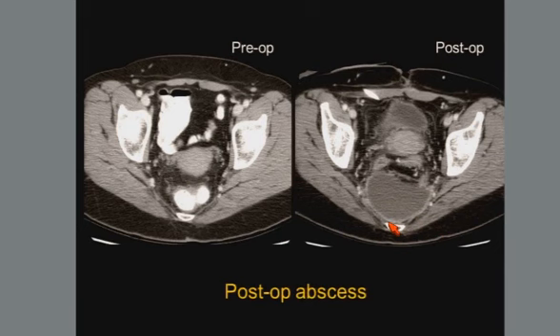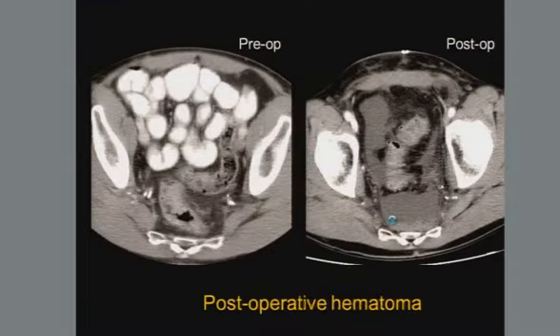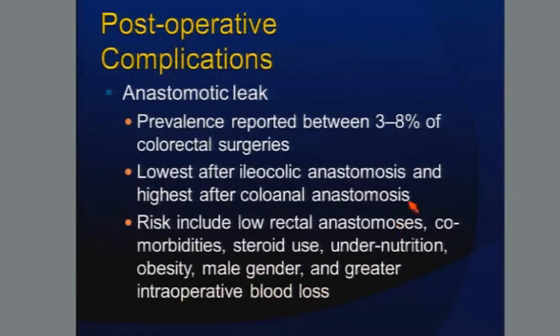This, however, has a slightly more worrisome picture to it. This was a postoperative abscess in the presacral space. I'm going to talk about abscesses in a minute, but the thick rind around it, the more encapsulated appearance to it, should raise your suspicion of an abscess.